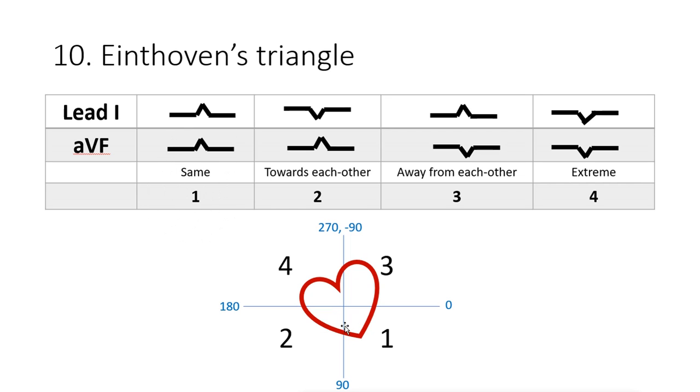And this first case lands in this quadrant. It is the healthy range, between 0 and 90. It is between this range, and it's physiological, okay? Instantly we can write that down, that between 0 and 90 is physiological, and we don't mark it as a pathology. That's the main thing, they don't want exact numbers. What they're looking for mainly is pathologies. If there's no pathology, they don't mind if you didn't mark it.